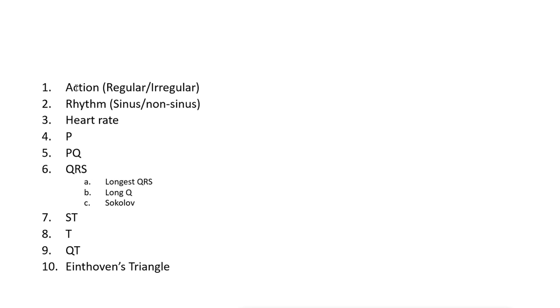That P wave is visible in either lead 1 or lead 2 all the time, before every QRS complex, and it is positive. After knowing this, we say that it is sinus rhythm, and you can't imagine how tricky this point actually is.